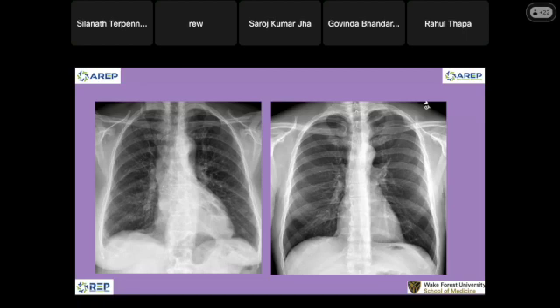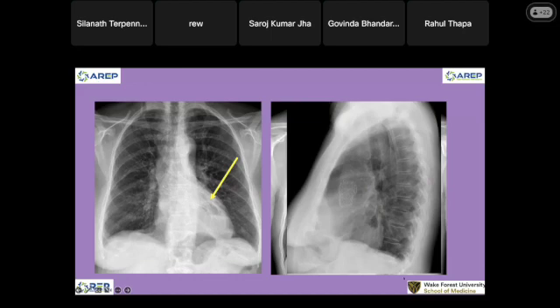I did not hear you. I'm sorry. So this is an example of the diaphragmatic hernia. Diaphragmatic hernia, good. See that? So we see all this air behind the heart. Are we okay? Air in the stomach. Okay, all right, next one. And I'm not telling you where it is, on lateral or anything.